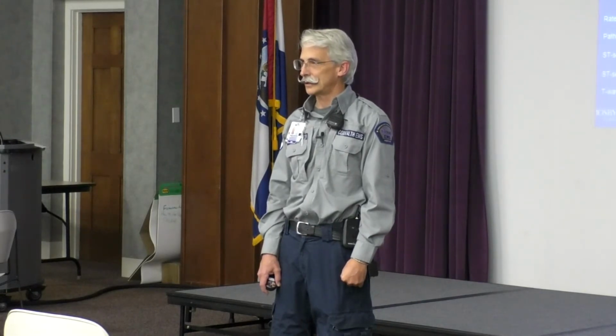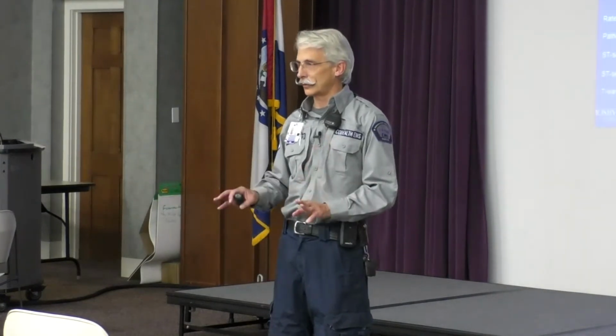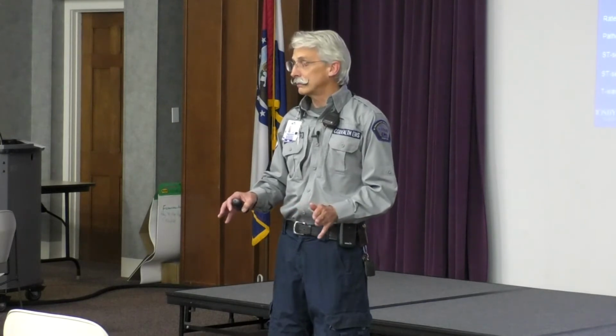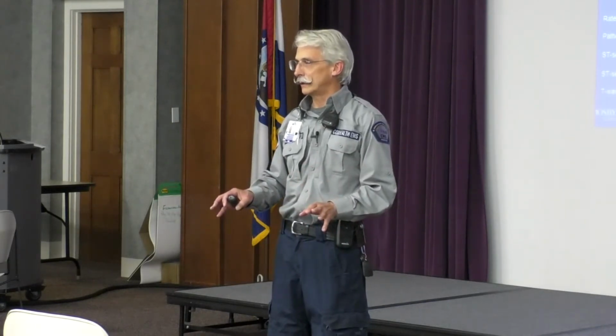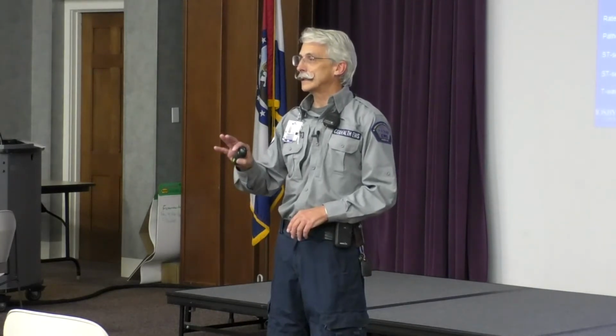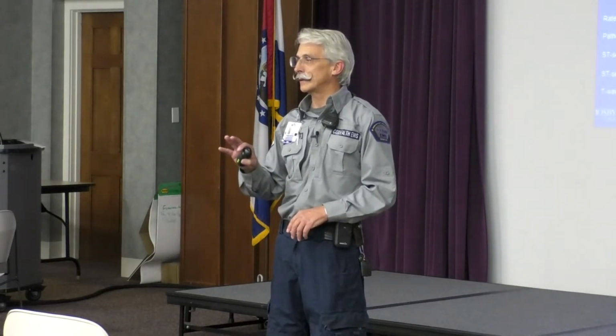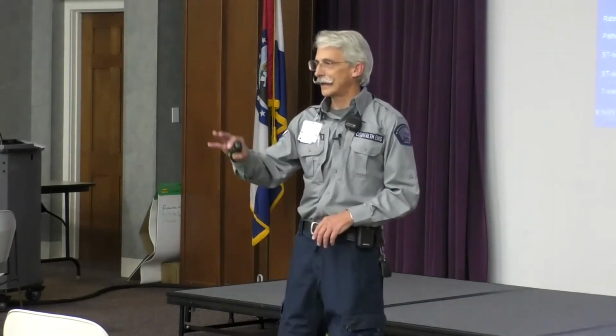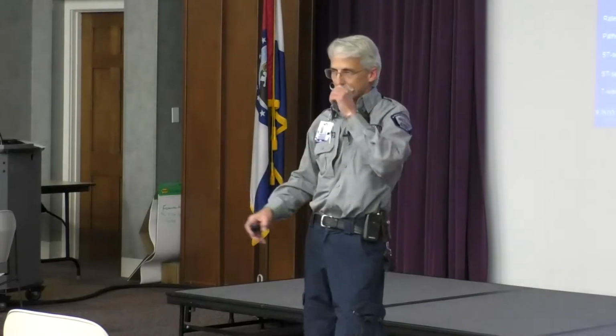Not in elevation of ST segments. You need to do a 12 lead. Right, but wouldn't that give you enough to tell you to go to a 12 lead? You might. I'm okay with you doing a 12 lead based on that, but seeing elevation in lead 2 does not tell me that there's definitely an MI. No, and I'm not saying that. I'm good with that. I should do a 12 lead.